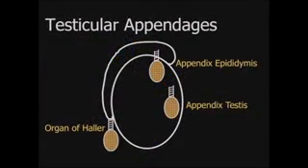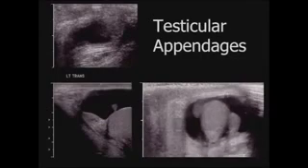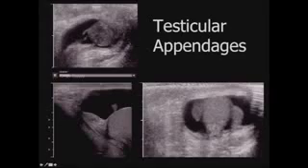The most common thing in the prepubertal male to cause acute scrotal pain is torsion of a testicular appendage, and there's several of them. The dominant players are the appendix epididymis, present in roughly a quarter of boys, and the appendix testis, which is present in approximately 95% of boys. And in the normal state, these are a little bit difficult to see. They tend not to be too large. You can see them here.